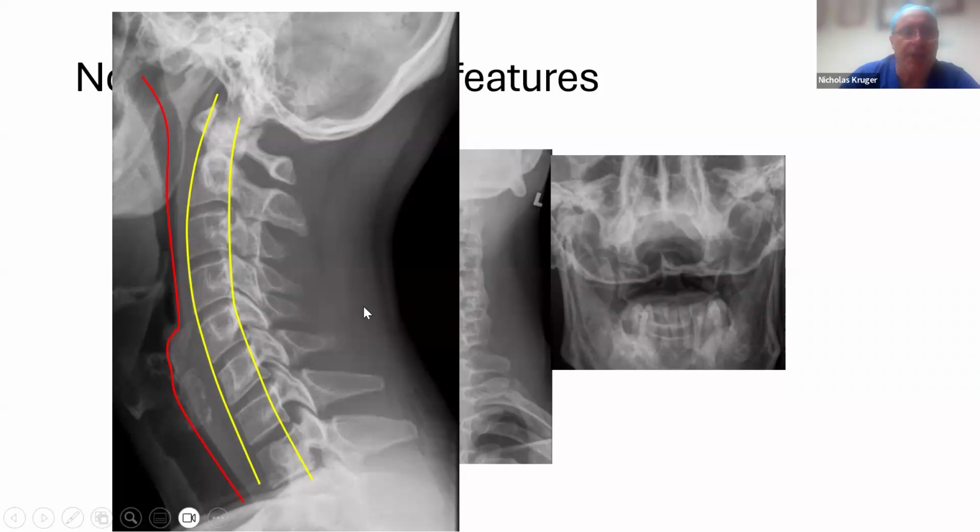The next line is the spinal laminar line, which sounds easy, but you often get confused when you're focusing down here because the facet joints can confuse you. If you're not sure, look at C2. You don't see the facet shadows, and there's quite clearly the line there. It's the base of the spinous process, where it joins the lamina. That's your spinal laminar line. It's a nice hard line, and the importance of that is that your spinal cord runs there.